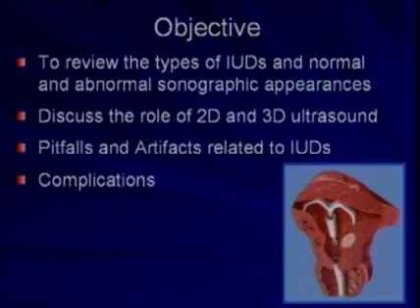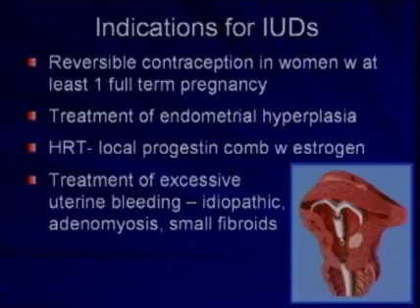The objective of this presentation is to review the types of IUDs and normal and abnormal sonographic appearances, to discuss the role of 2D and 3D ultrasound, and to review the pitfalls and artifacts related to IUDs, as well as the complications.